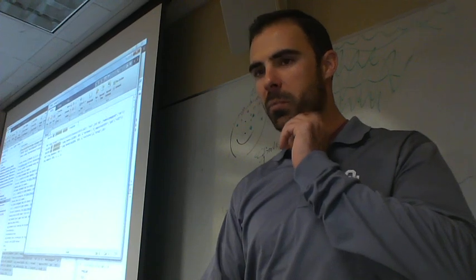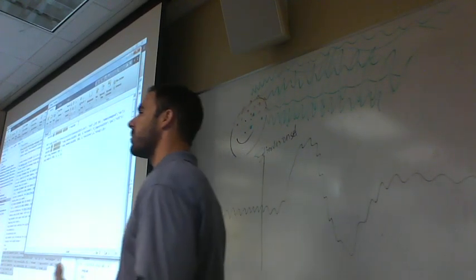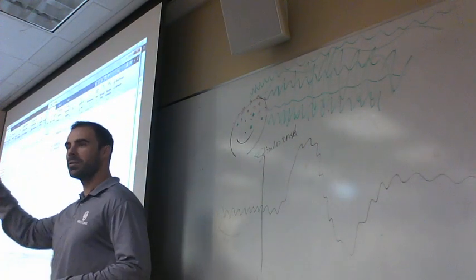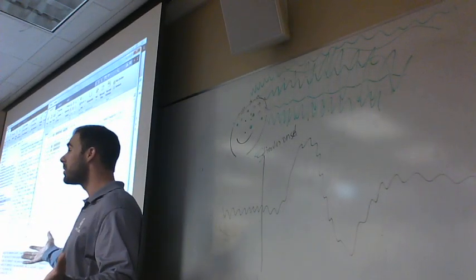Right click and paste, and we just paste that same information, okay? So let me walk you through what this means, because I said we're going to accidentally learn to code a little bit. This is how we're going to accidentally learn a little bit, all right? What we did with our GUI, we just used our mouse button, okay? All we did was load the data in. That's it, right? Super easy.